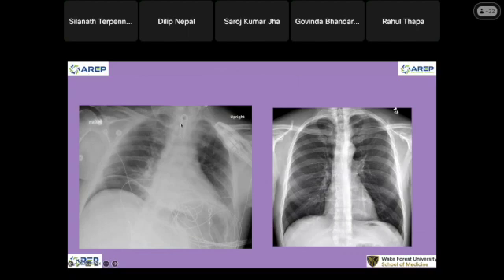And here we have the tracheostomy, and we don't even see the left lung here. A good breath, it's all gone. And the heart is here. Every day we will have studies like this, probably almost 80% of cases. This is my midline, and the right lung is crossing 20% across the midline. This one will be easy, but the one that is really sick, and this is my aorta.